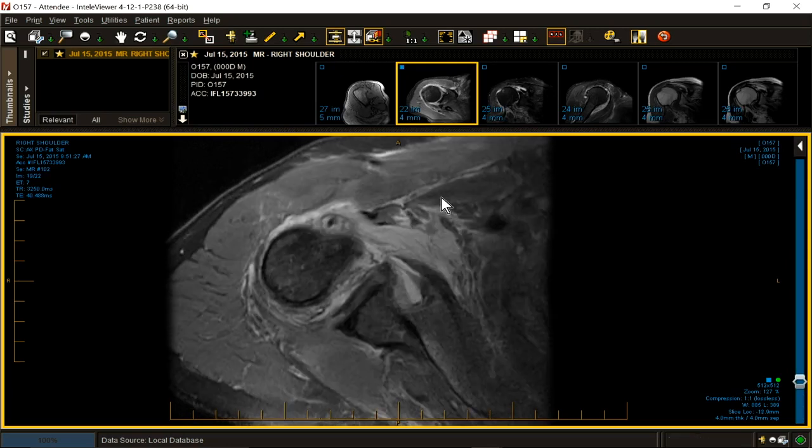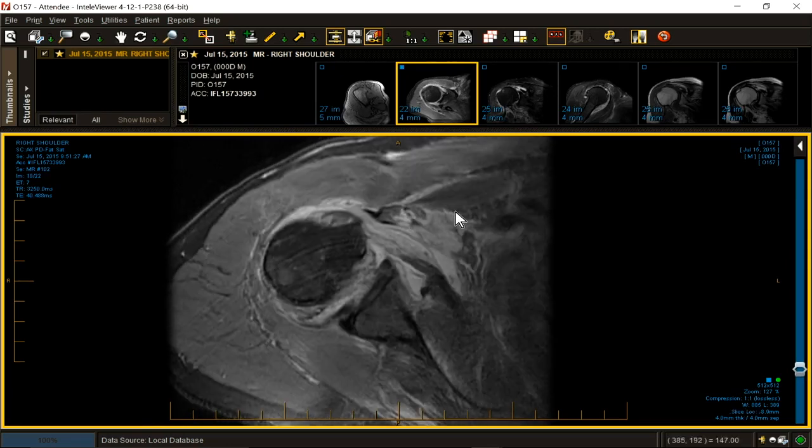Let's keep looking, shall we? What's all this? Muscular tissue? Could she have a muscular tear? So with the axial projection, we've already figured out she has a massive rotator cuff injury, possibly a muscular tear, and she didn't dislocate. That's pretty good, right? We haven't looked at most of the study yet. Let's do it.